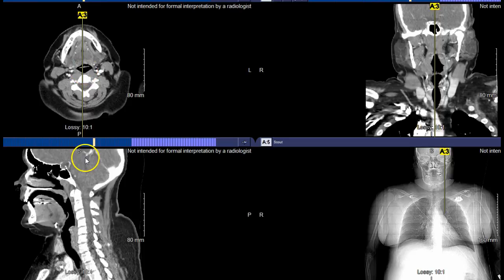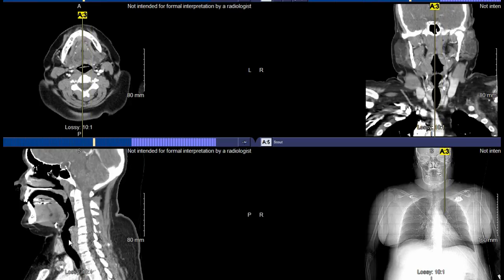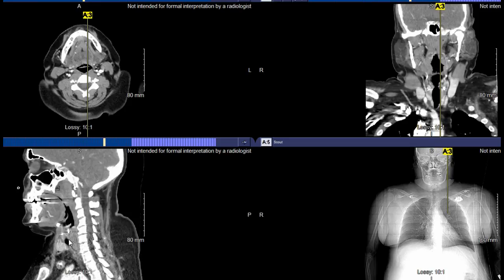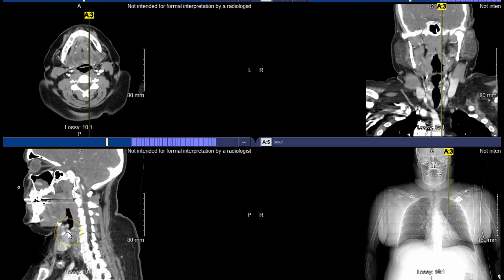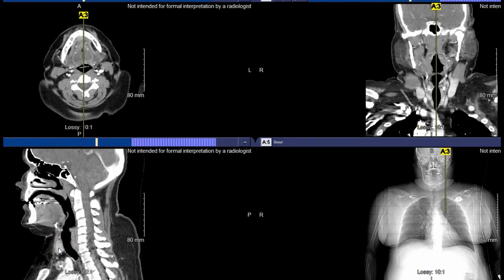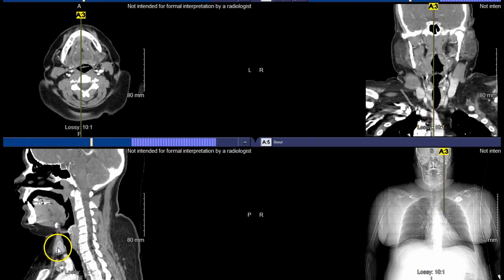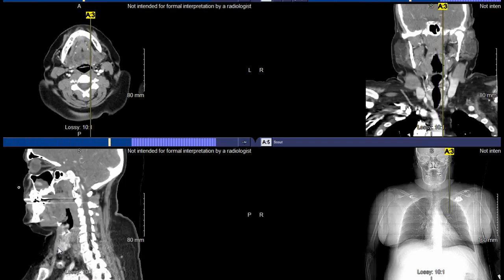On this particular patient, it's going to take on different appearances, but at least on the superior aspect, you can see that relationship is maintained: the anterior position versus the posterior position. Let's see a structure that I hadn't really pointed out. The vallecula on the anterior aspect of the epiglottis is demonstrated there. I've also talked about the thyroid gland itself, and we can visualize that somewhat well on these respective slices.